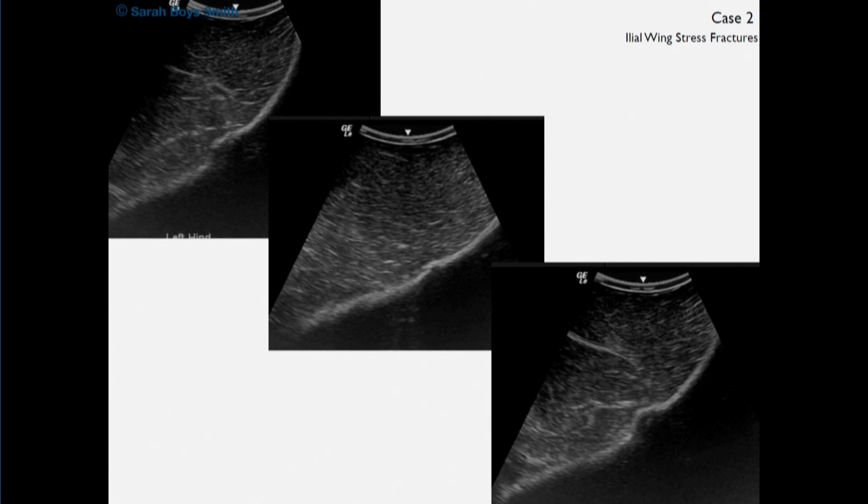So the bone scan in this case indicates that although ultrasonographically this appears more chronic, it is still clinically relevant because it is still hot. Okay, so it is important sometimes to use those two imaging modalities together.